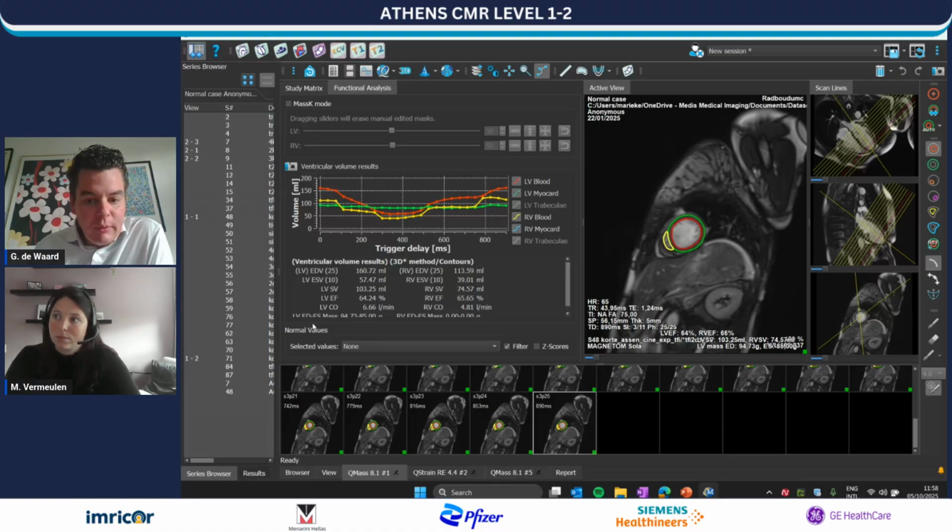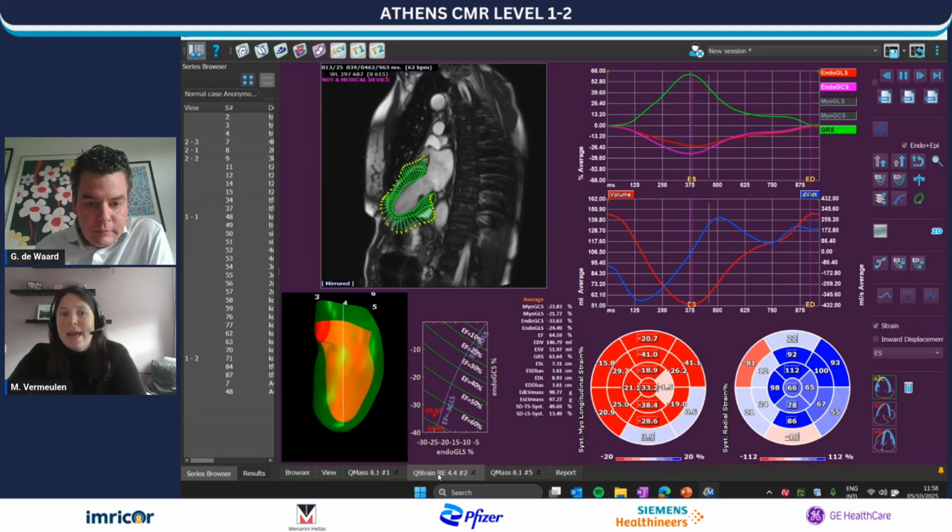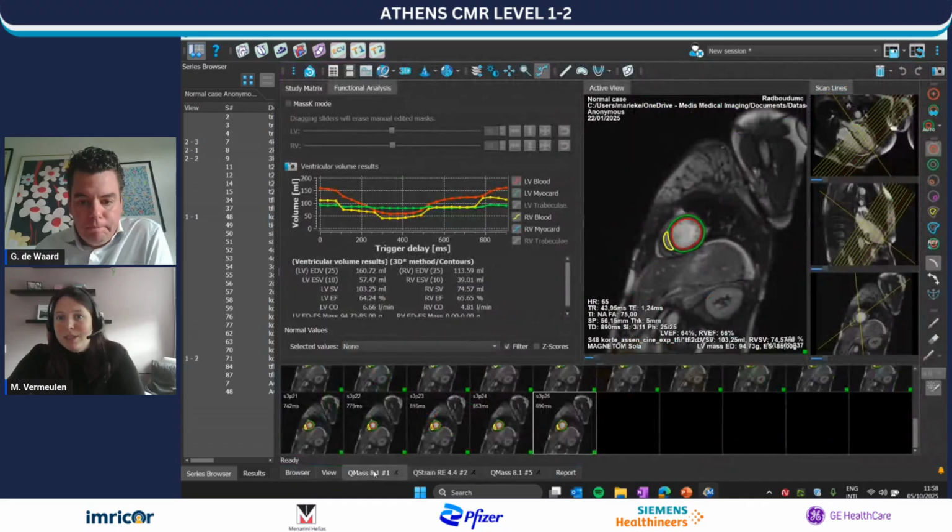So I think we can go to the next case that we have lined up. Now we're gonna show some pathology. Or you want to show the strain first? Sorry.